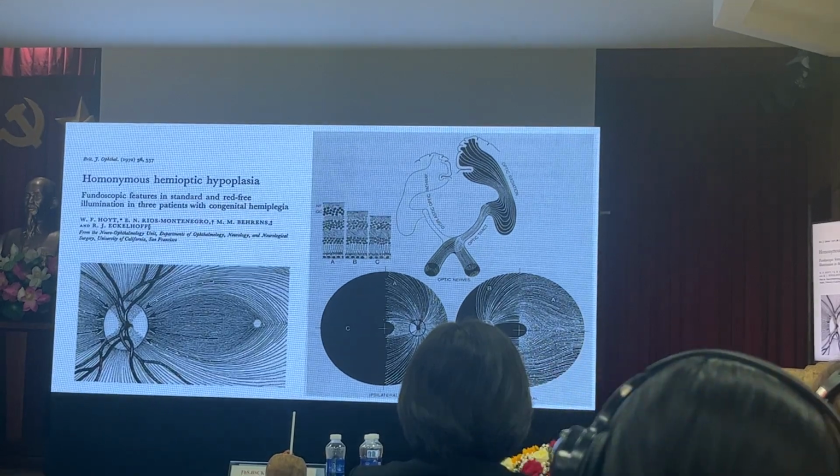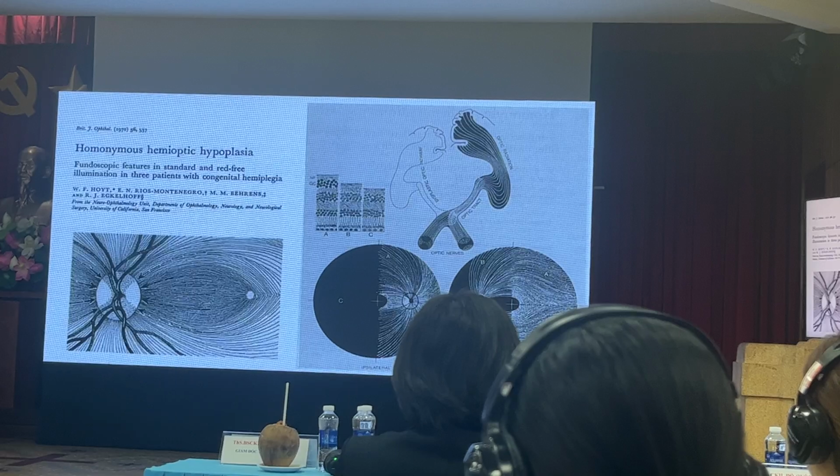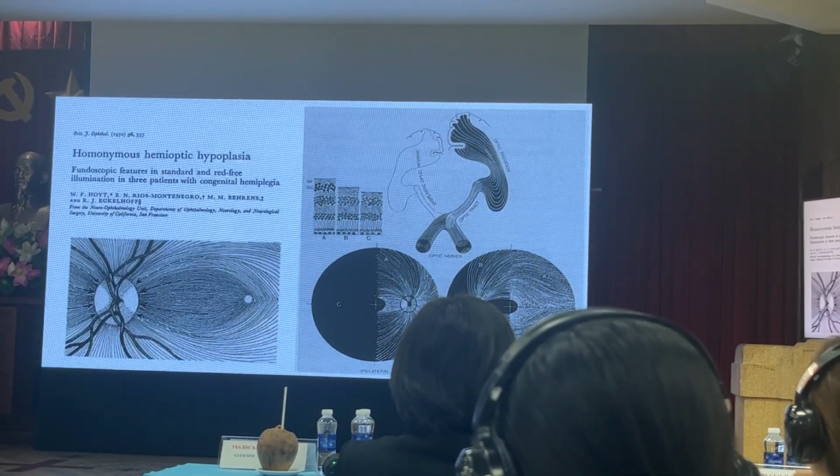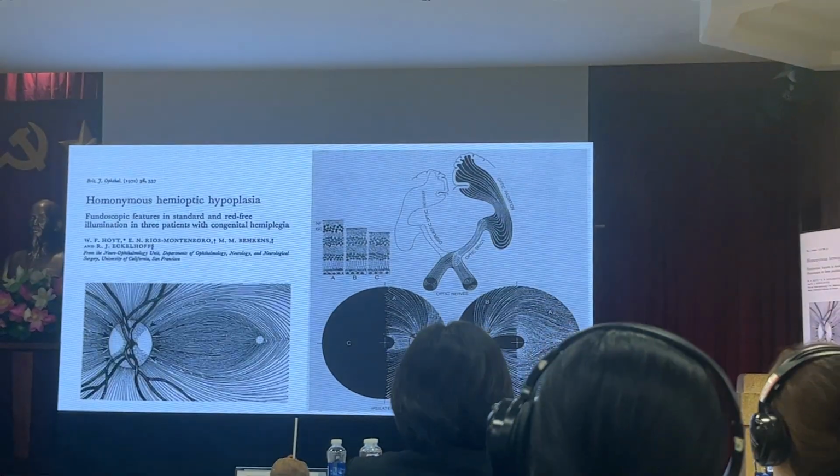So if you think of the literature, there's a nice paper from Hoyt from 72, just by looking in fundus red-free images, look at the nerve fiber layer.